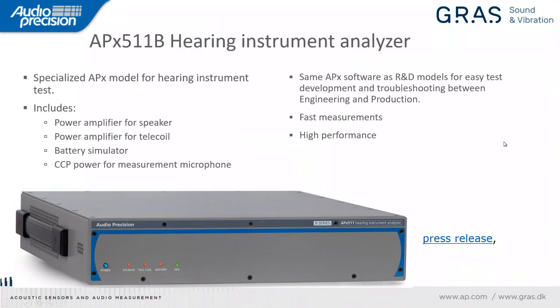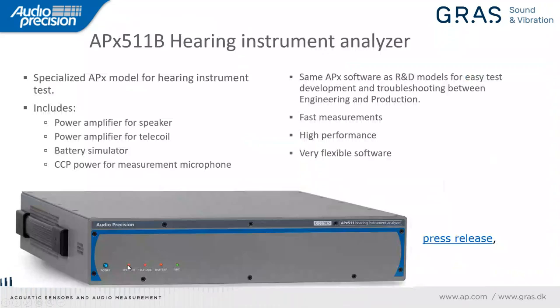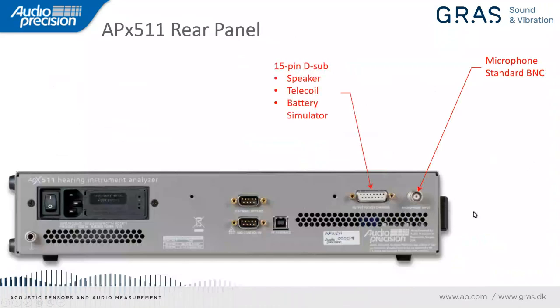Now the 511 is a little different from most audio precision analyzers because it has no connectors on the front panel. It just has a series of LEDs that power if the speaker is being driven, the telecoil is being driven, the battery, or the microphone bias power is on. On the rear panel, we have a standard BNC connector for the microphone, and then we have this 15-pin D-sub connector, which carries the signals for the speaker in the box, the telecoil loop, and the battery simulator.